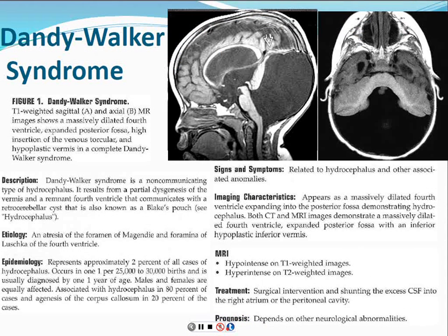Another thing that we will often detect on prenatal ultrasound imaging is called Dandy-Walker syndrome. It's actually an abnormality of the cerebellum, where this is a normal cerebellum. It should meet in the middle and have this midline structure called the vermis. In this case, the vermis doesn't form, and you get this big cystic CSF intensity area. So it just looks like a really giant fourth ventricle.